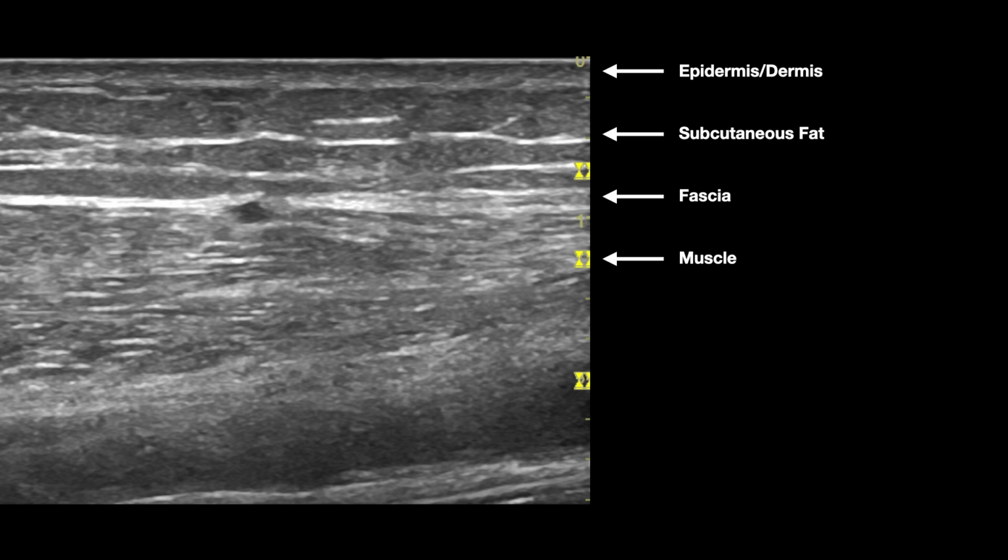This becomes really important, because as we look at this, we can say this is normal, and then as the tissue becomes inflamed, this echo texture and this echogenicity are going to change. We'll see that displayed in some images in upcoming slides as we get through this presentation. But that's really the picture of normal sonographic soft tissue anatomy that I want you to see and burn into your mind, because when we start doing things to the soft tissue, we're going to violate this picture.